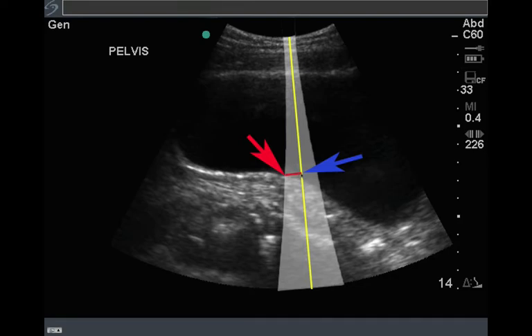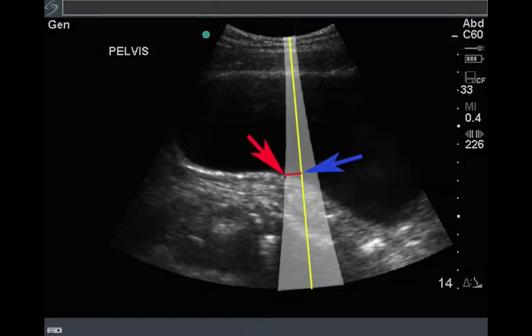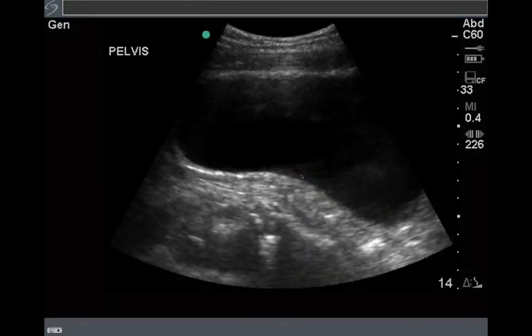The ultrasound machine has to assume that that reflection is coming from the center, where actually on the image, it should be black here, but because the reflection is coming from the edge, some grey is put there, and that's because of a beam width artifact. The beam is actually wider than that single line, which the ultrasound machine would like to think it is.